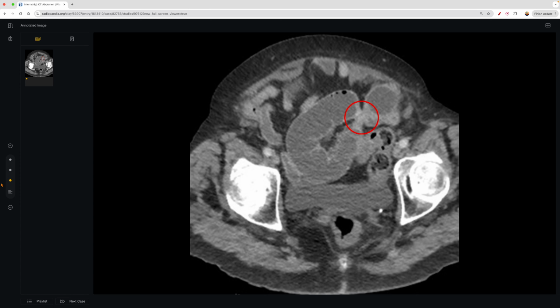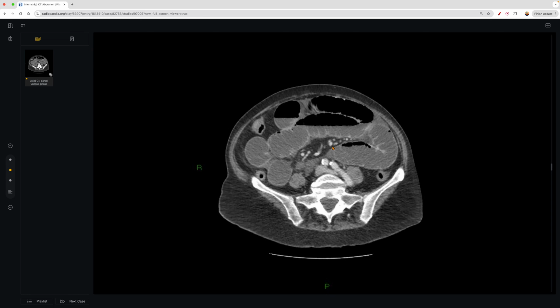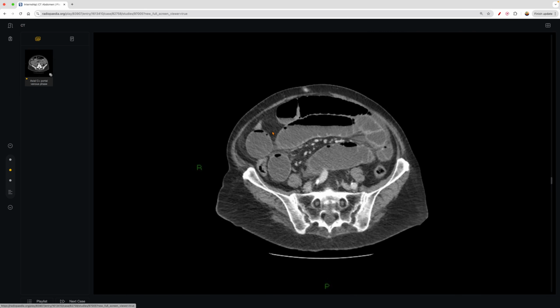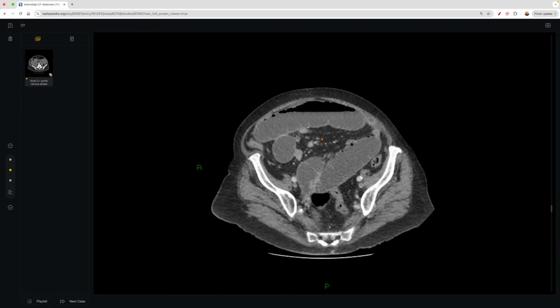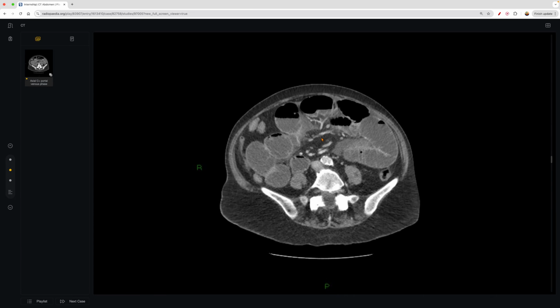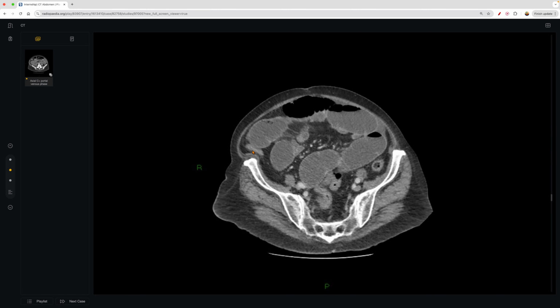What you'll see, which is pretty useful to think about and know, is that prior to the occlusion, there'll be backing up of fluid and contents and air, right? Again, we consume air as we eat, drink, whatever the case may be. But after the transition point, there's not as much air or contents, because it would have been expelled through the rectum or it's not having a chance to pass through. And that's why here it's actually hard to appreciate some of the large bowel.